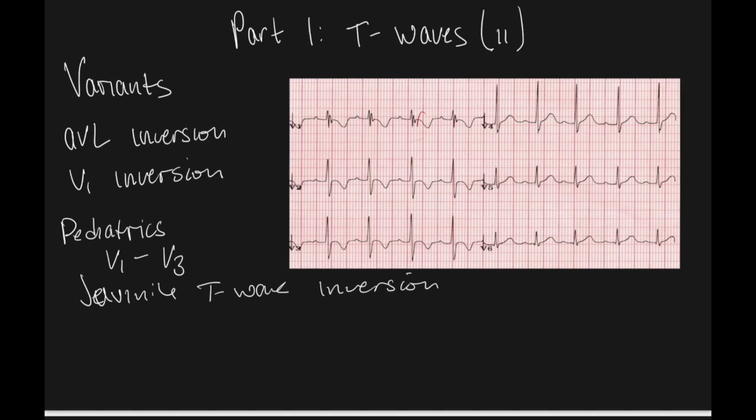Here we have those nice inverted T waves in this 2-year-old's EKG.